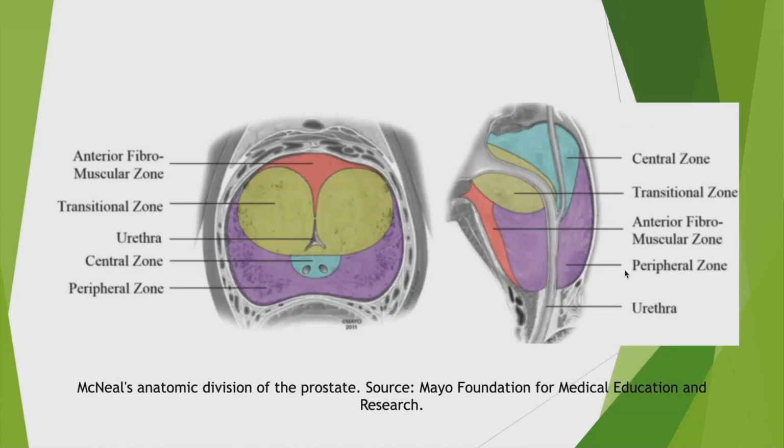On sections that will ultimately resemble your classic anatomical sections, you notice that an anterior zone is logically prominent on a cross-section. At the back, we'll have what we'll call a peripheral zone close to the rectum. At the central level, it will logically bear its name, the central zone, and then between the two, that famous transitional zone, which will end up being a little like this, in the form of two lobes that will surround the urethra, and will be responsible for our patient's dysuria when this transitional zone swells in prostatic adenomas.